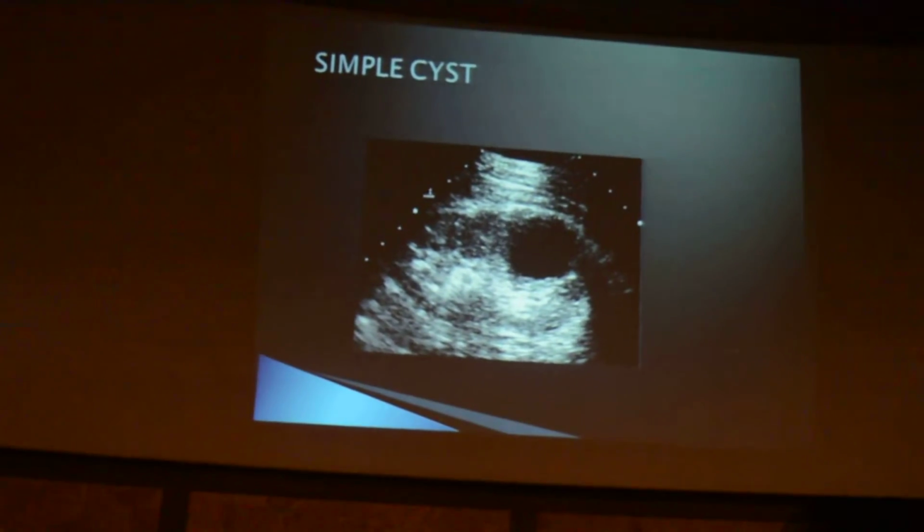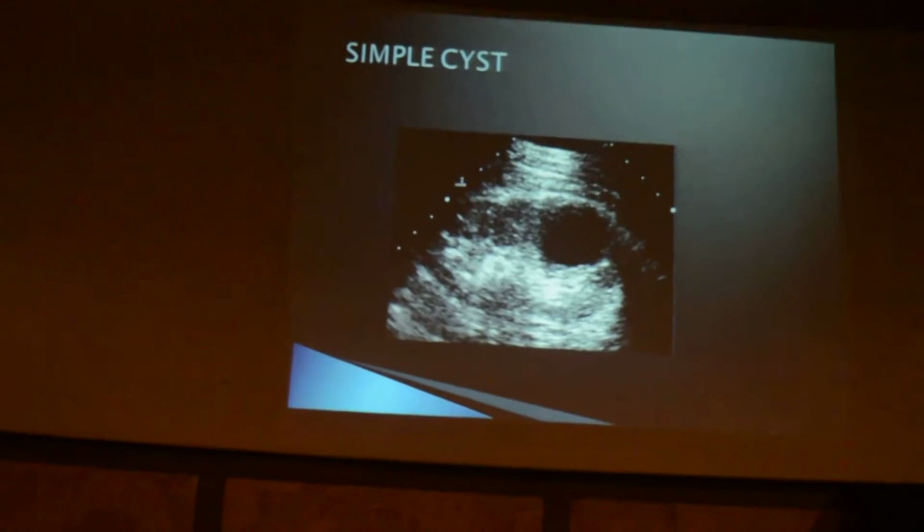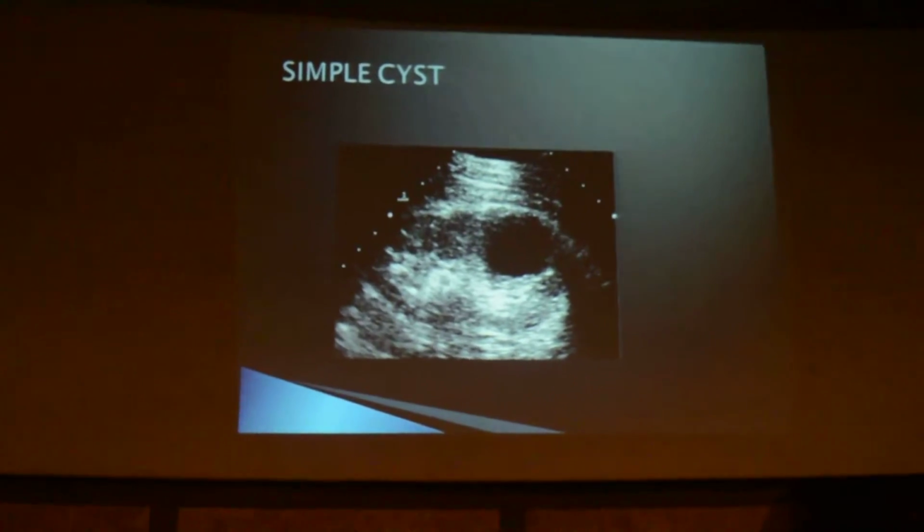This is also an image showing a simple cyst, type 1, Bosniak type 1.